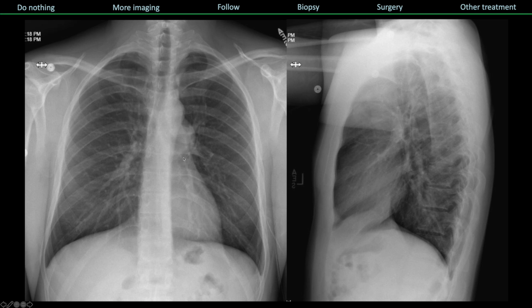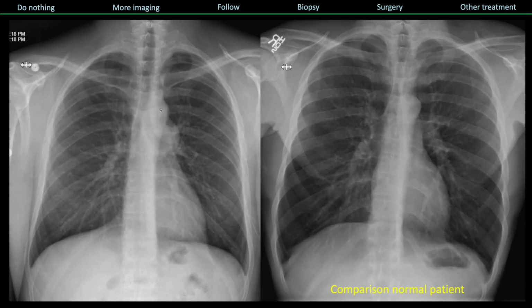And we know that that's not pulmonary artery because we can see the pulmonary artery bump through it, and we can actually see the hilar structures through it. Okay, so that's a bit of the hilar overlay sign, meaning it's either got to be anterior or posterior. And I could buy, there's a little bit of vague soft tissue or increased attenuation anteriorly, but this mass does one other thing. It displaces this line medially, and you only see the right border of it. And that line is what's known as the anterior junction line.